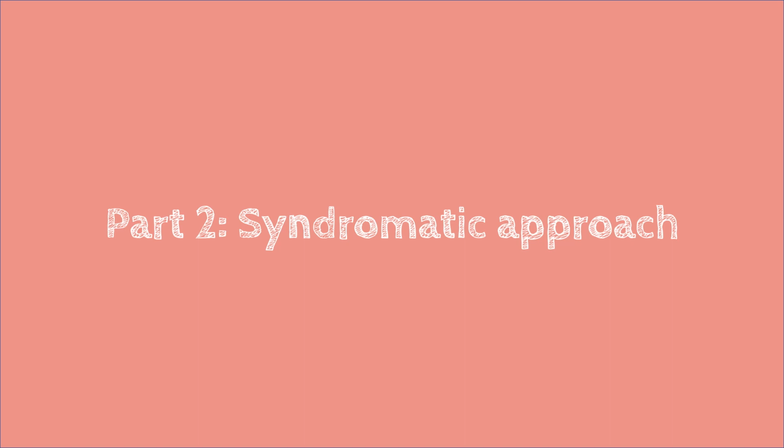As we mentioned earlier, if all leads are taken at one time, then all things at that time should kind of exist in all leads. It may be buried in some of the leads, and that's why usually lead V1 and extremity lead 2 are the ones that are easiest to look at, to see things that you need to see.